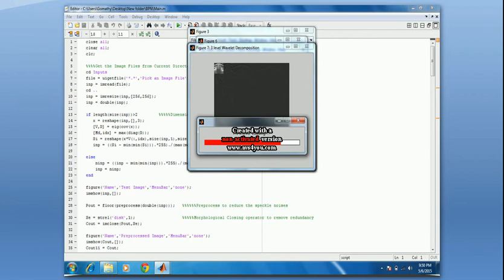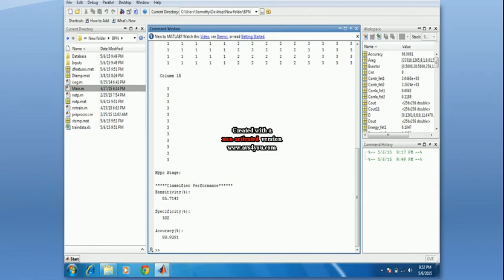For classification, we need testing and training. Finally, the test image features are simulated with the trained network to make a decision on the thyroid stage, like abnormal or normal. This image will show it clearly. Here, hypo stage. So the given input image is a hypothyroidism case.